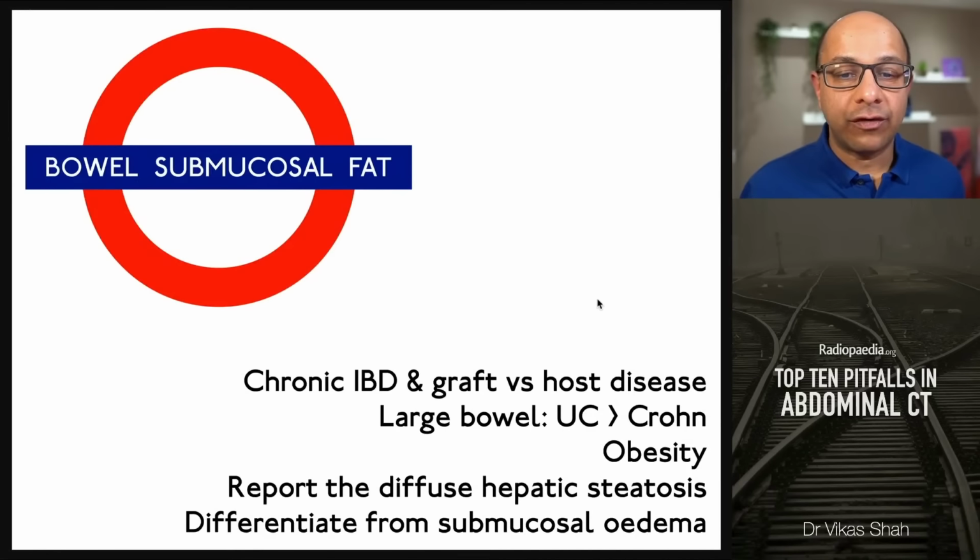And you'd actually be better off reporting the possible diffuse hepatic steatosis in those patients, for which at least some management can be instituted for that very important metabolic disease, compared to putting them through unnecessary investigations for the bowel. So one thing to note is it's important to differentiate submucosal fat from submucosal edema that you can sometimes get with bowel inflammation.